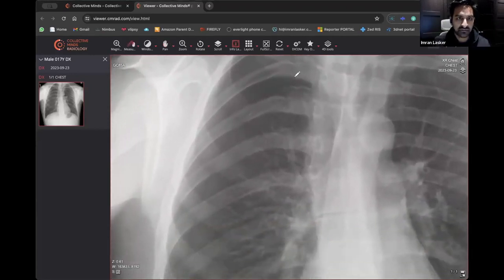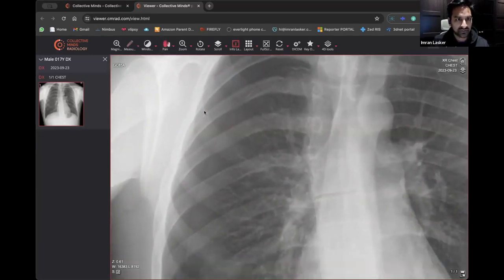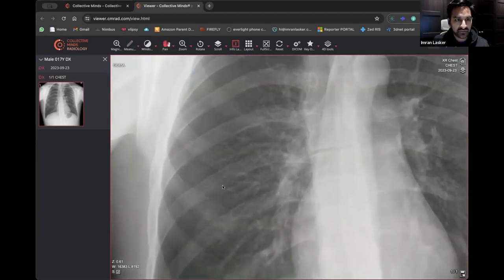And the way to do it is to really follow the ribs right from the back all the way around the side. And this is where it gets a little bit confusing. But if you really do follow, you can see all the way to this edge. And then you've got the anterior edge of the ribs. Just do that for every single rib, right? So let's have a look and just make sure there are no obvious fractures anywhere.